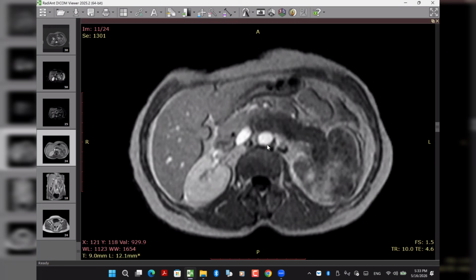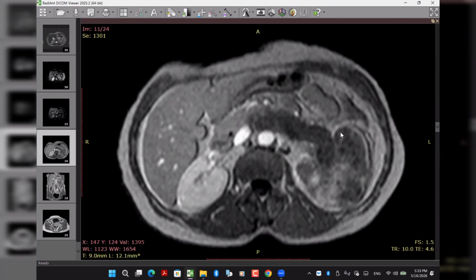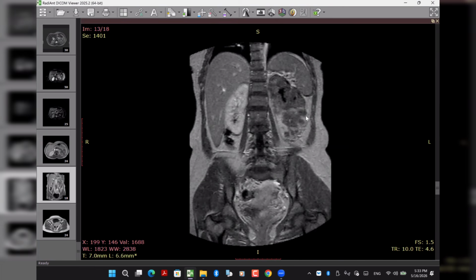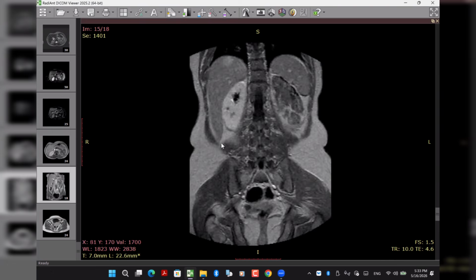Unilateral enlargement of the kidney with the extension of low intensity signal inside the left renal vein that crosses the midline and joins the IVC, but not extending into the IVC. And the renal parenchyma is heterogeneously enhancing, mainly at the cortex, with preservation of the left renal vein wall enhancement. Here, you can see. I switched it to the coronal, can you see? Yes. And this was an accidentally discovered hepatic hemangioma.